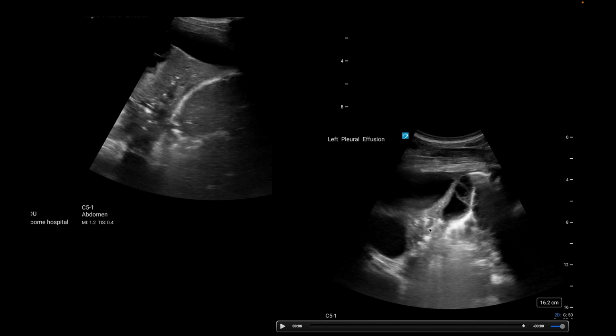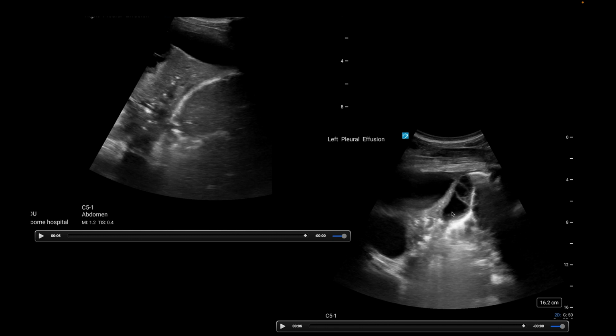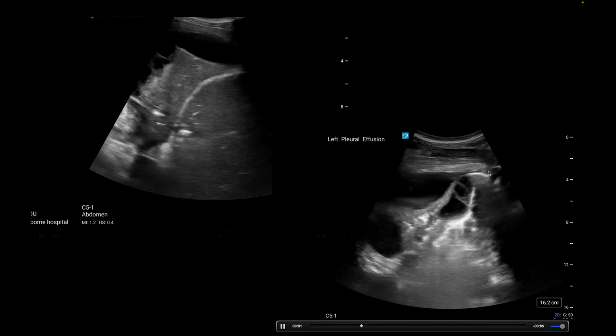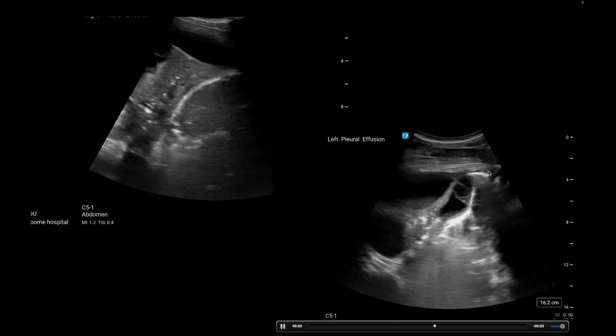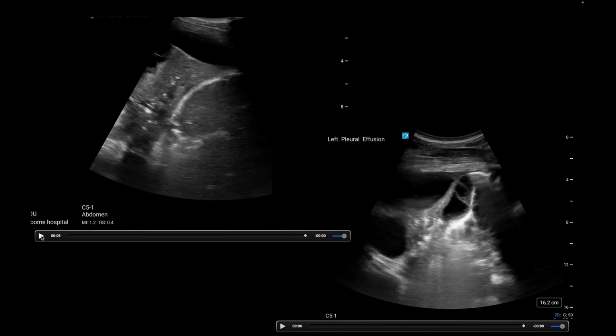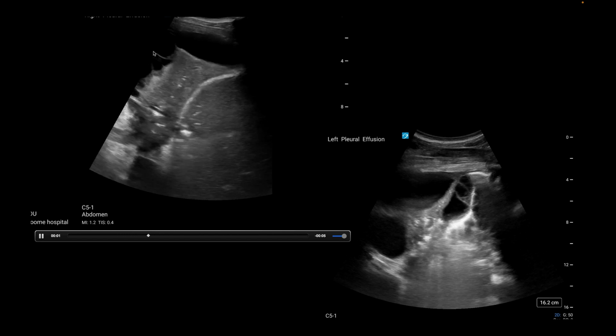They had a known effusion previously but had become unwell now with fevers, and the most common cause of empyema in patients like this is whatever it is that brought them into hospital. So this patient came in with MRSA sepsis, and then they were found to have this. So this is almost certainly a staph-related empyema, because these fluid collections are bacterial breeding grounds.